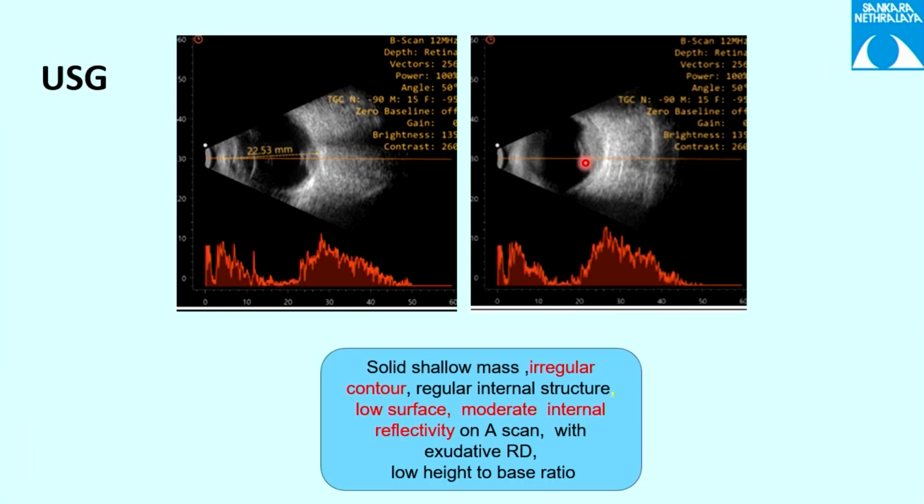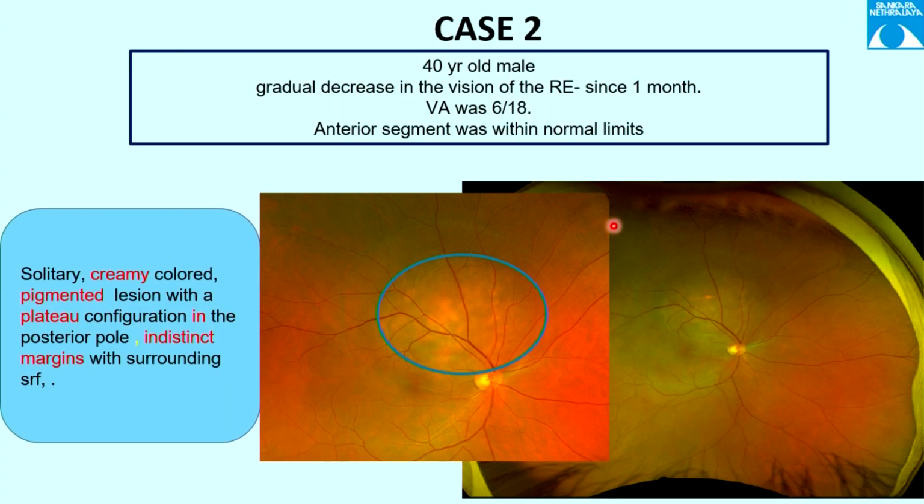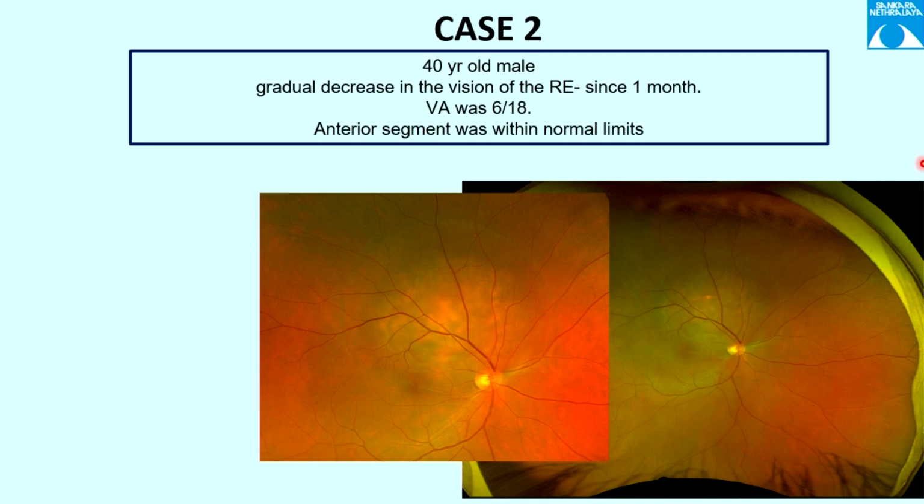Now if you see the fundus photo, go back to the fundus photo. Now you see what is more prominent here. Some orangish things, though not completely orange, this is a globular lesion. You can see some orangish lesions here. It's a very uniform dome-shaped lesion.